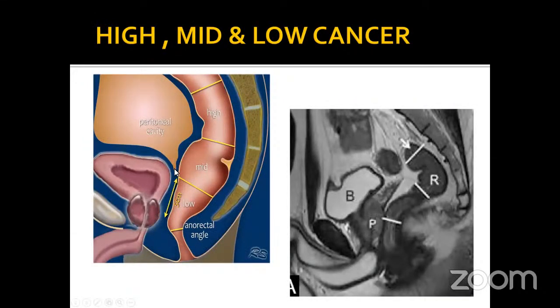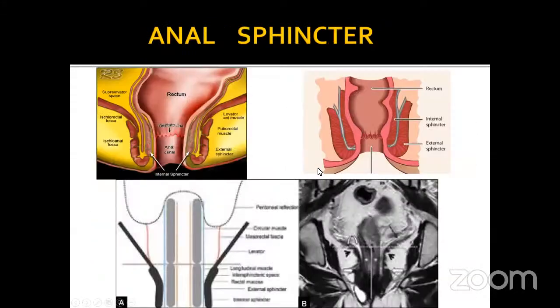Here I would like to mention this is the anterior peritoneal reflection. I will show it on MR again. It is very important for mid and high rectal tumor. Why is anterior peritoneal reflection identification important? So we need to differentiate low rectal cancer from high rectal cancer. One idea is the distalmost 5 centimeter is the low rectal tumor. Some people classify in this way.